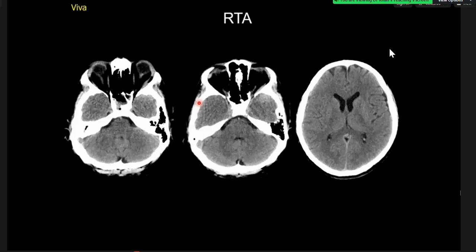On the left side, there is some air density. Temporal, middle cranial fossa. Is there something happening there? Yeah, there is some low density anterior to the midbrain. No, that's okay. You see, this extradural hematoma, which is in the middle cranial fossa, has come in the exam quite a few times. It's a difficult one, and that is why I'm showing you an example.